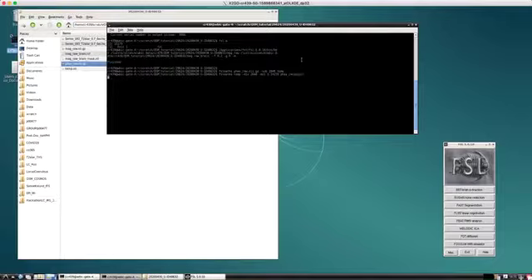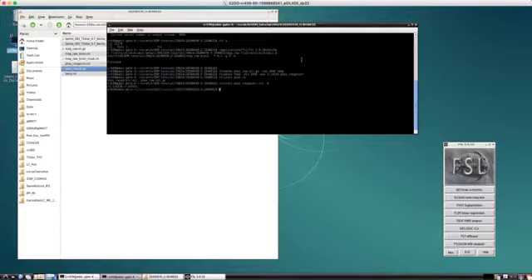This will be your phase data, and you can check this by using fslstats on the range corrected image with the R option, which gives you the limits, and you can see that it is more or less between minus 3.14 and 3.14, minus pi to pi. Great, so now we have prepared our data.